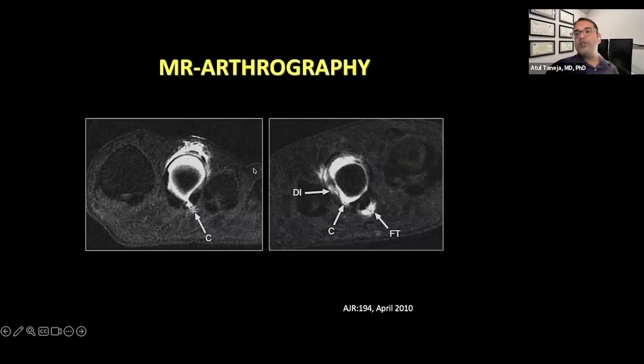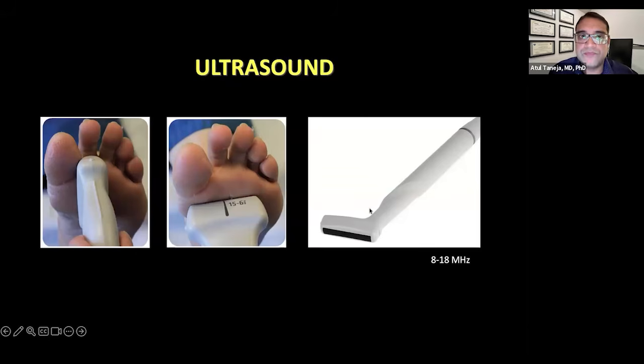that were done way much more frequently before, they're not needed anymore. Why? Because we have high magnetic field strength, high resolution images that we don't need to poke the patient, inject contrast, invasive method for a plantar plate injury, and I'll show you how easy to see on the conventional MR. So in this case, contrast was injected, and we can see the plantar plate injury to the lateral aspect with extravasation to the tendon sheath, just like I mentioned.